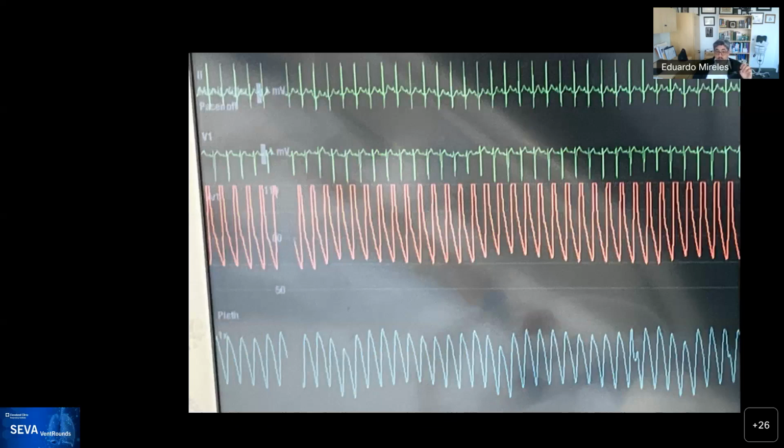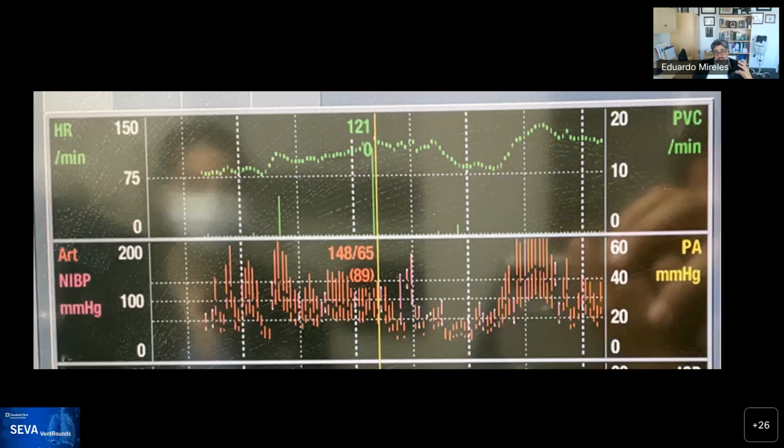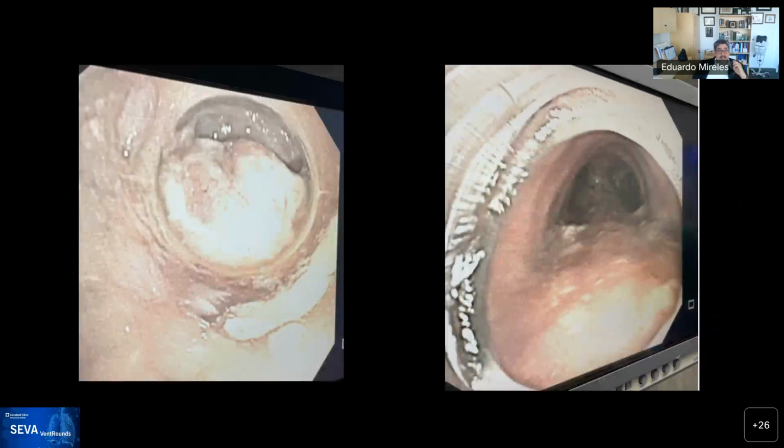Now the question is why? Whenever you have a trach that has been replaced and you have this feature, now you know that the inspiratory resistance is not as bad, but the expiratory resistance is horrendous. This is classic for a ball valve phenomenon in which air goes in, but then as the patient exhales, something obstructs the airway, and the patient has very high pressure.